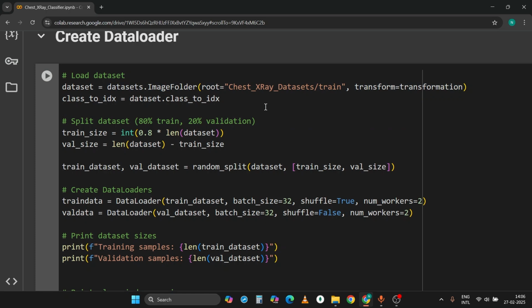Since we are not manually deciding which index value represents which class name, we have to know how this function defines the image index value for each class. For that we use dataset.class_to_idx. It gives us which index value is representing which class name.